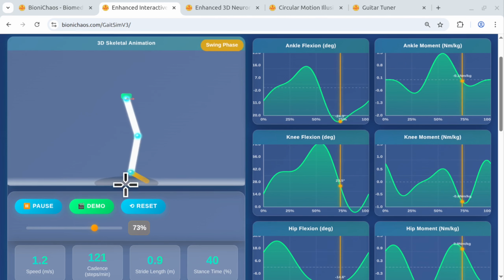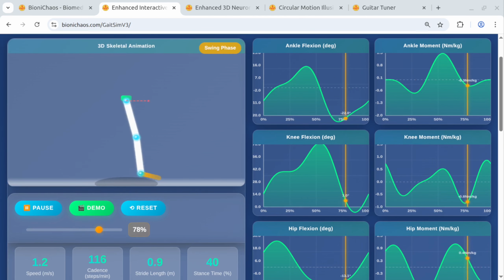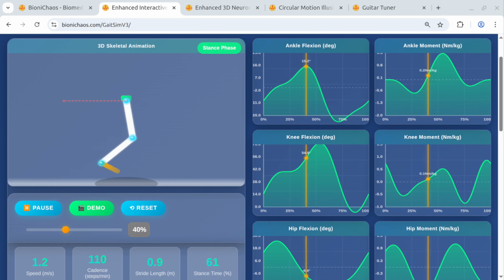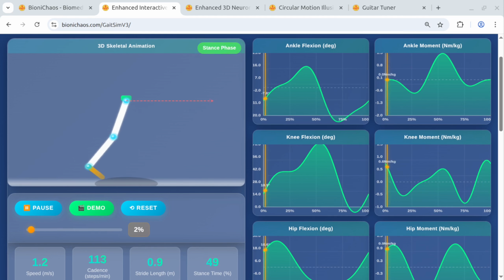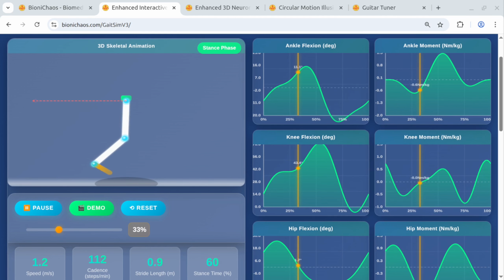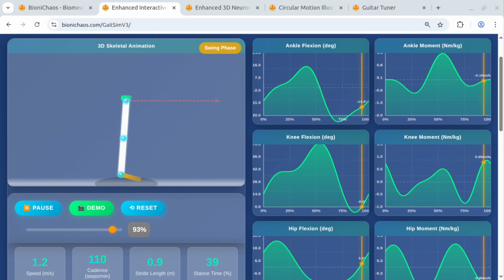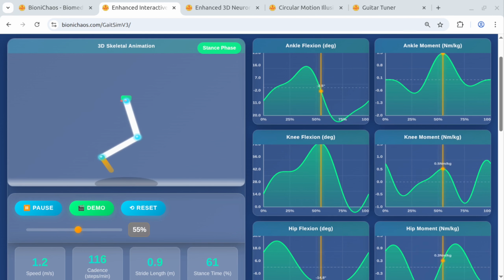There is a shadow at the moment, but I don't know, it doesn't actually do anything. Thank you for pointing that out. You are correct. There is a shadow. However, I was referring to a more prominent visual indicator that clearly defines the ground plane and shows how the foot interacts with it, possibly by highlighting the contact area or showing pressure distribution. This would make the simulation even more intuitive for understanding ground contact.